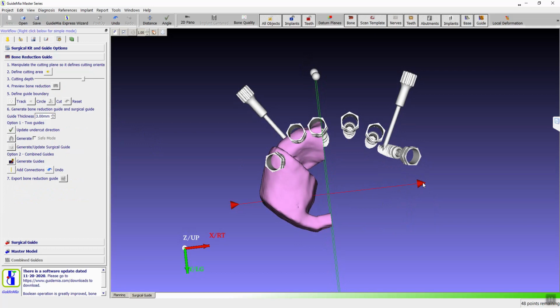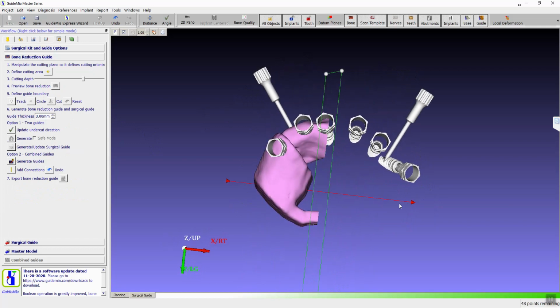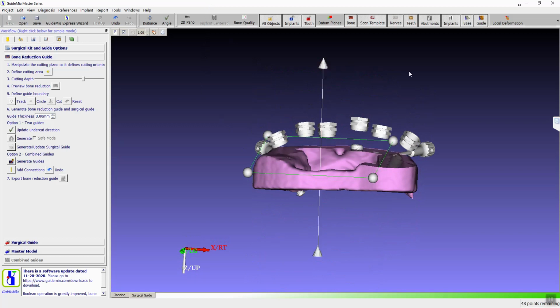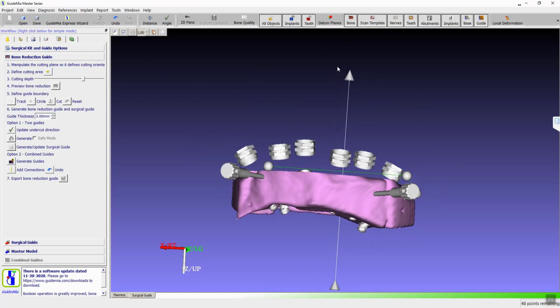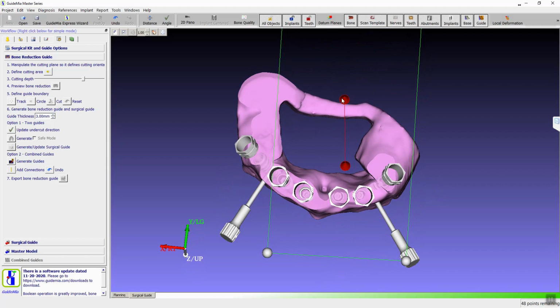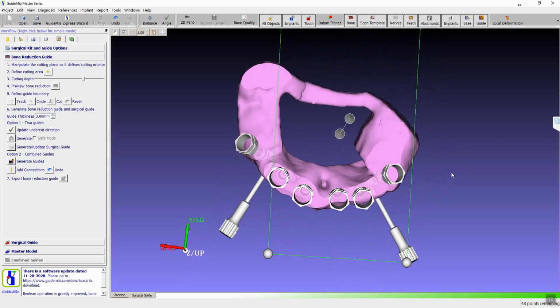We're going to rotate. I always try to put the screen like this first, then we rotate the view so that the arrow points to us. Then we rotate that. We move the plane up to determine where to cut. You make that look so easy, Frank. Yeah, I'm wiggling around the whole screen. This is just a little trick: middle button to move this up and down, and left button to rotate and tilt the plane like that. So that's how we do that.